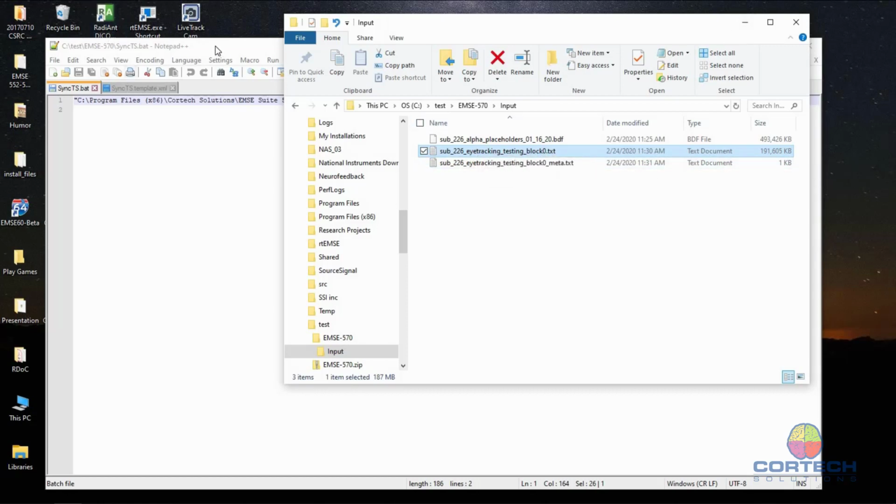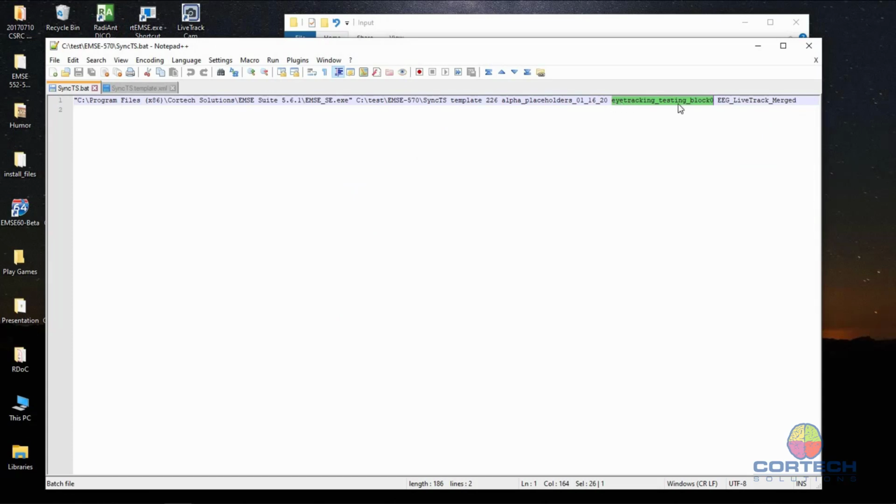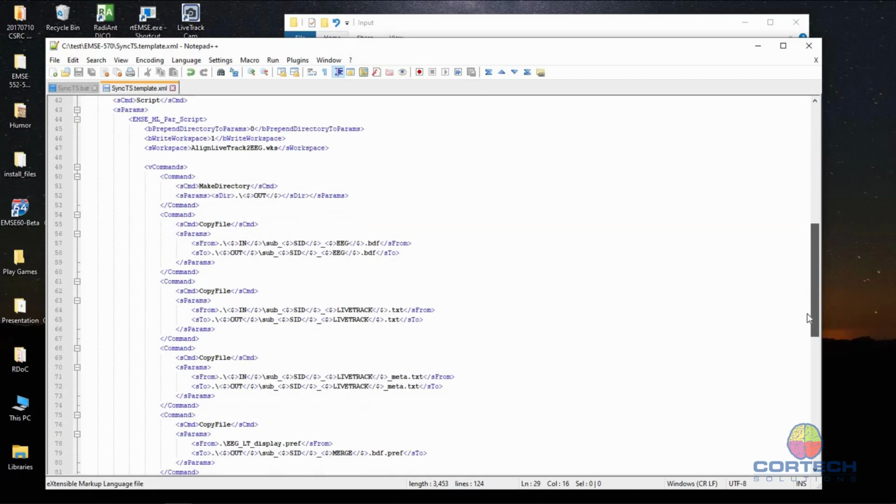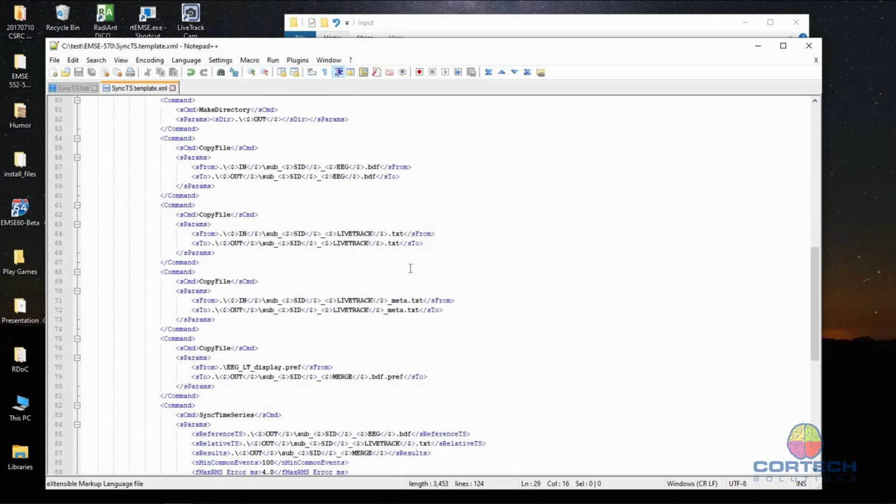and that's what we're provided in the third parameter. That value will get filled in here, the double dollar sign. It will get the abbreviation live track, which then gets used down the script here. So we're going to do the same thing.